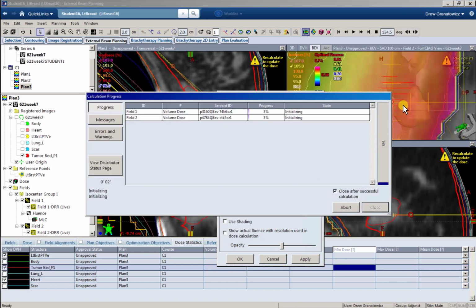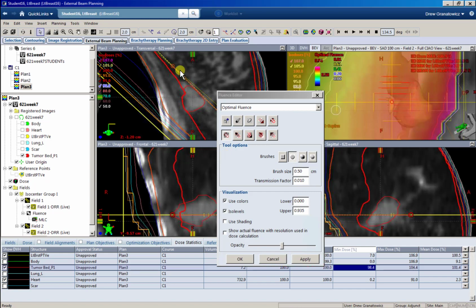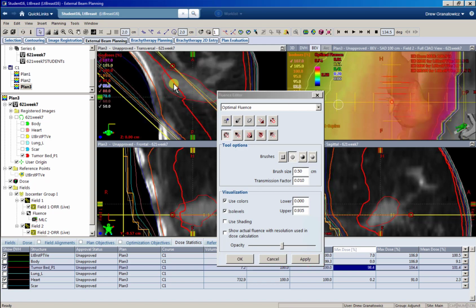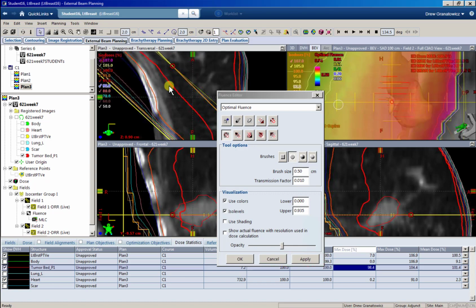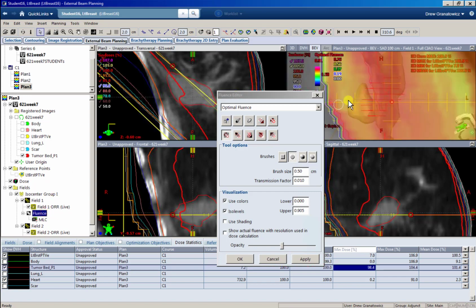Watch this cloud right here. See, it got a little bigger. But again, we're adding very little at a time. So now this second slice up is pretty much covered. We're getting there. So now we can ignore the very bottom.